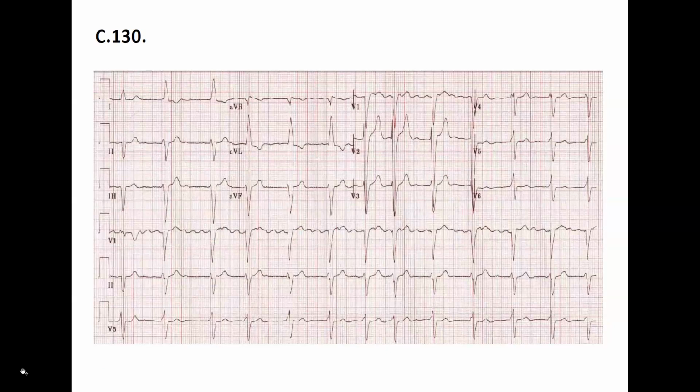Now, let's see again. Don't look at the top part. Look at the bottom when we do have the rhythmic strips. Okay, here. This is rhythmic. Oh yeah, there's a bigger distance. So it's not rhythmic. The average heart rate is around 75, around the normal. Good.